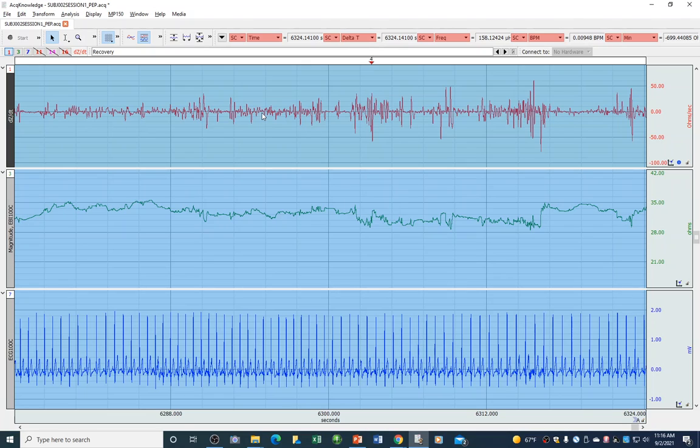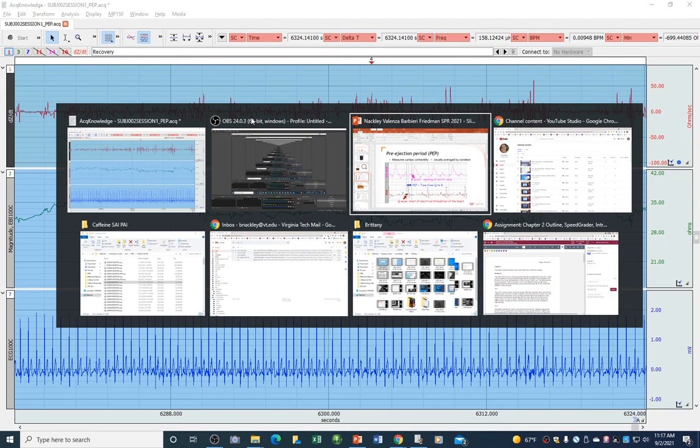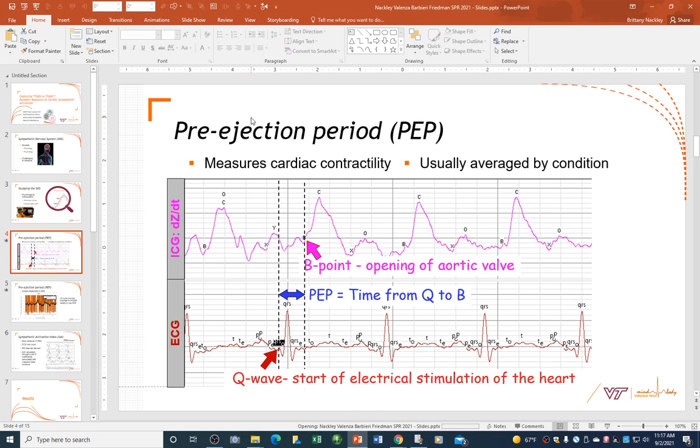What we want to do is a tiny bit of homework, so-called, before we take our next step within the file. We want to look at a prototypical DZDT signal up close. So I'm just going to show this from within the video so you can see it and not have to tab off of anything. This pink signal here is a prototypical DZDT signal.